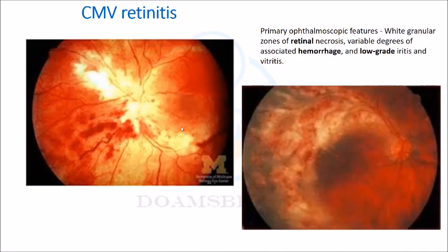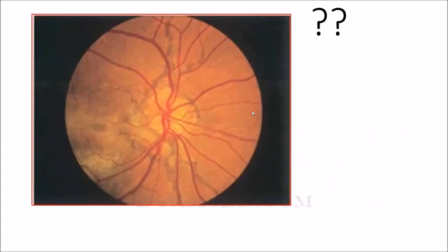For that, I have shown you many big lists of diabetic and hypertensive retinopathy before, as there is hemorrhage. Anyway, what is this? It is very easy now to identify. Other than Dr. Farial, can you identify what is wrong here? Anyone, please?